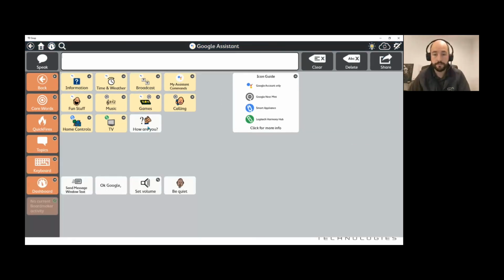And then I press my button. How are you? I'm fine. You're very kind to ask, especially in these tempestuous times.